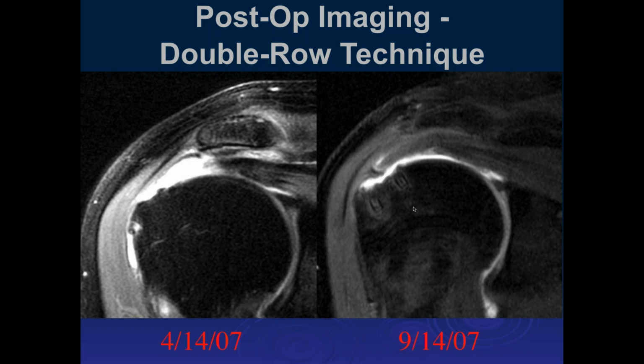That doesn't look like it's all adherent right here. It looks to me like it's still torn. Yeah. What we can see is that the tendon's in a little bit better position here, but I agree. This was an arthrogram injection, and we see contrast extending into the area where we really would like to see a good repair.